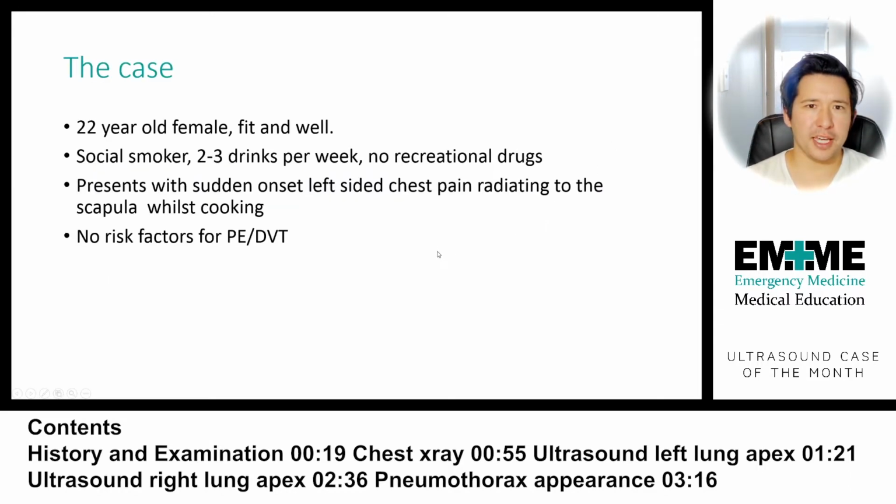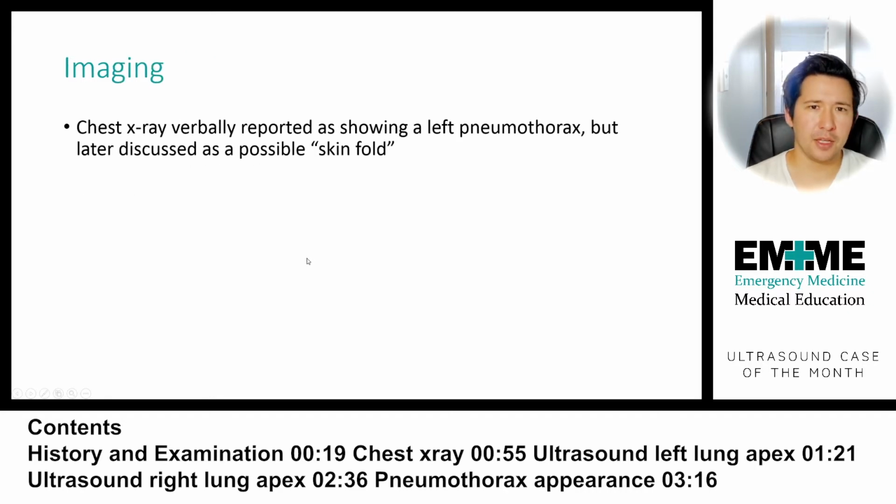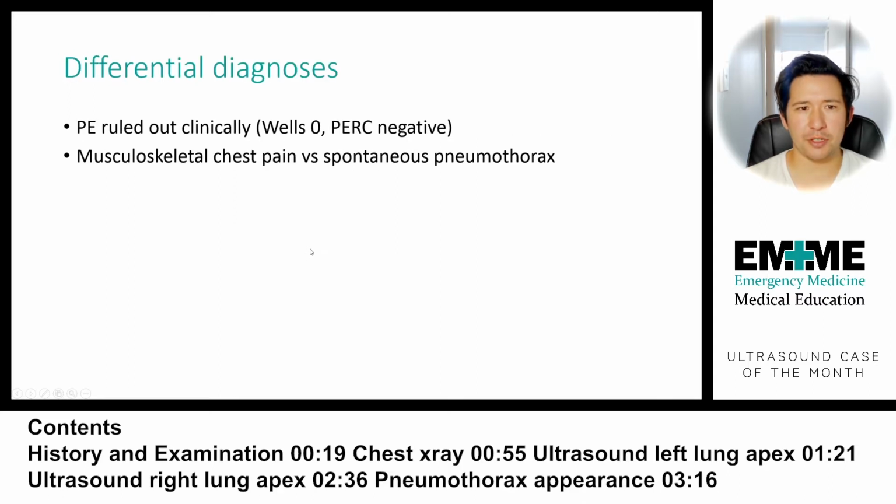So this is our third case. We had a 22-year-old lady come to the emergency department who was generally fit and well and presented with a sudden onset episode of chest pain while she was cooking. She didn't have any risk factors for PE or DVT. She looked well, had a basically normal examination. She had a chest x-ray that showed this possible left pneumothorax, but it was possible that it was also just a skin fold, and I'll show you the x-ray in a minute.